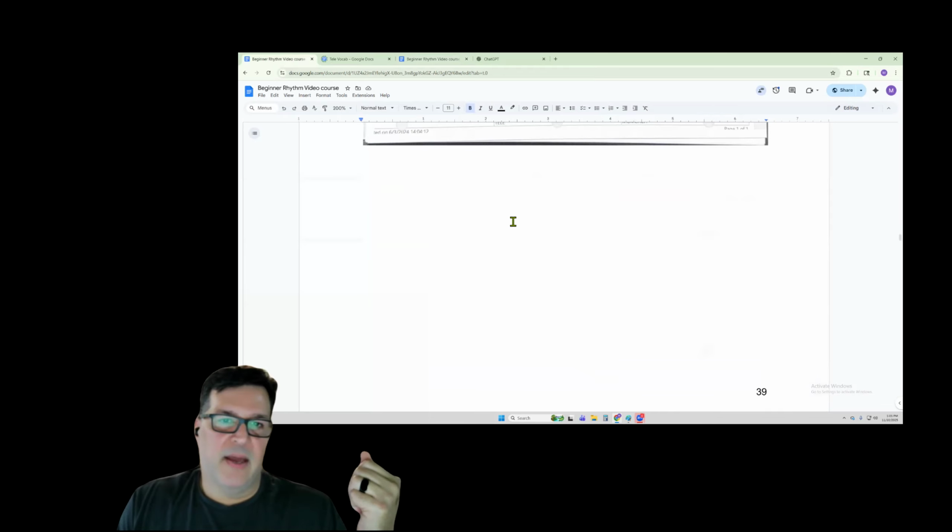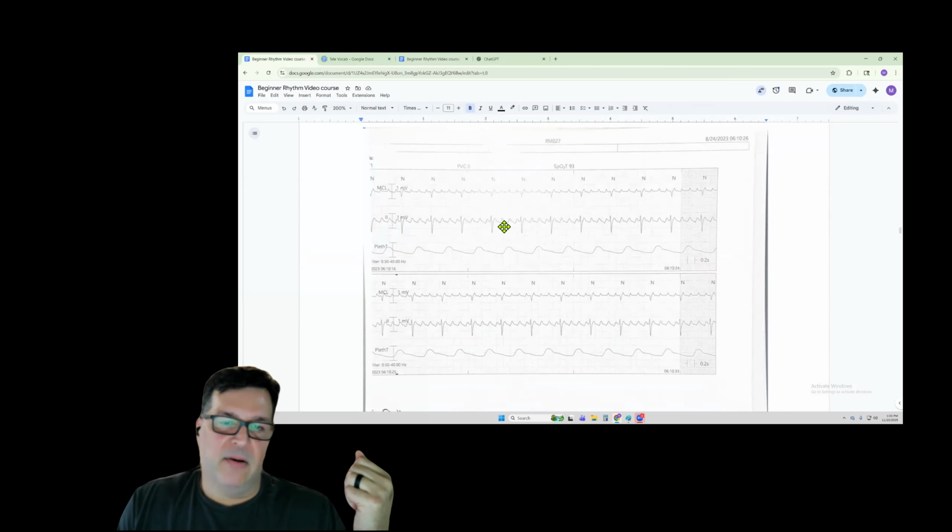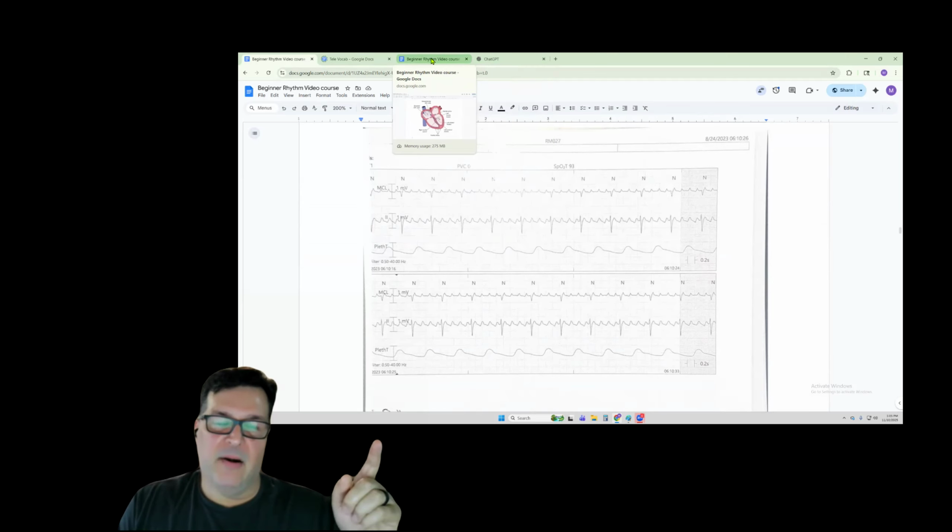And that is why you'll have that consistent pattern of flutter right there, because it's a very regular pattern of contraction in the atrial chamber.